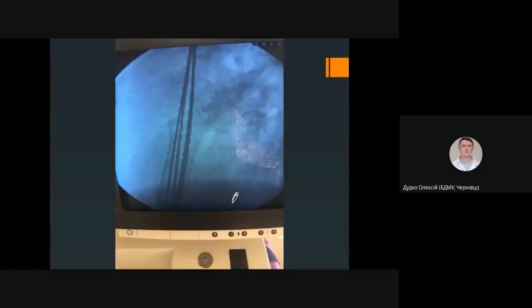That is actually another X-ray, but you can note that this is not a film. This is an image from an image intensifier, and we can see the position of the humerus after the reduction was done, and K-wires were used to fix the fracture.